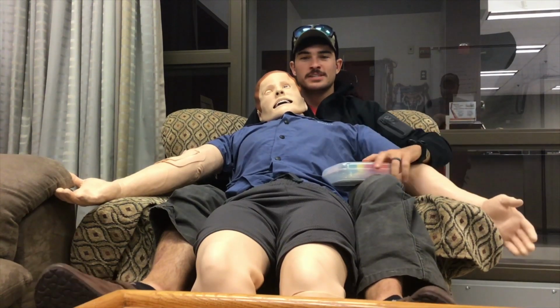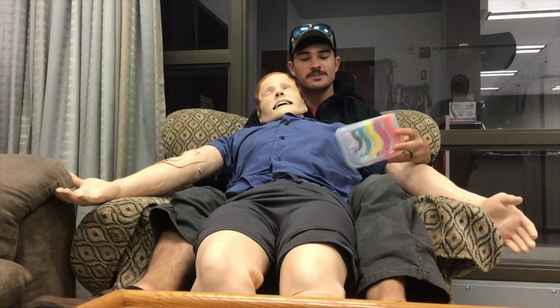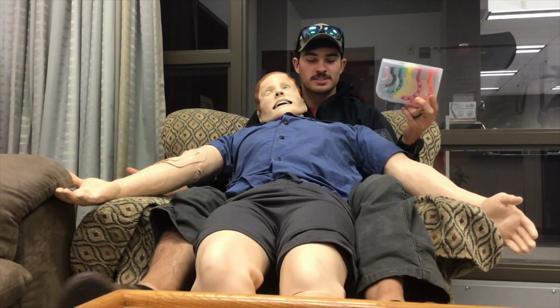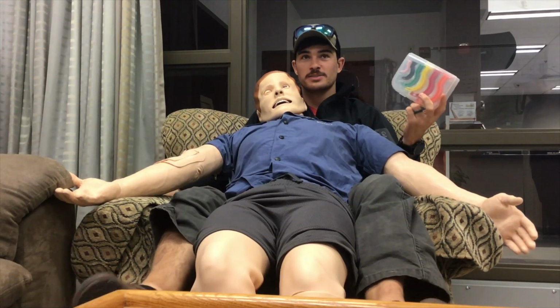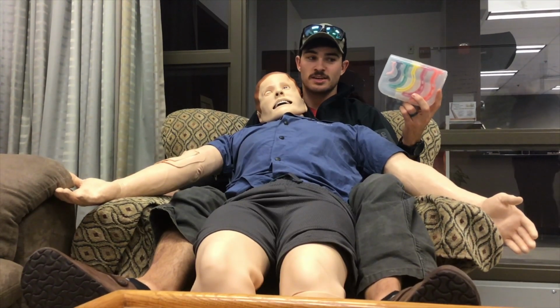Hello, I'm here today to talk about OPAs, or oral pharyngeal airways. Some indications for using these are a patient that is unconscious and does not have a gag reflex, so we don't want them to aspirate, vomit and breathe it in. Contraindications for OPAs would be if they have a gag reflex or there's an airway obstruction besides the tongue.